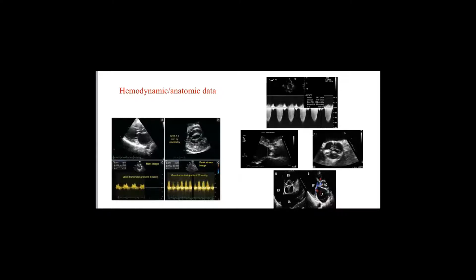Exactly. Now, on the flip side, if you have an aortic valve that looks pliable and soft and opening widely, but I get a gradient of more than 40 mean, this is also discrepancy, isn't it? Yes. What do you think about this? Because sometimes the visual aspect might mislead you. You might see the valve is opening well, but maybe it is not that. Sometimes obstruction, we have seen cases at the tips of the aortic valve.